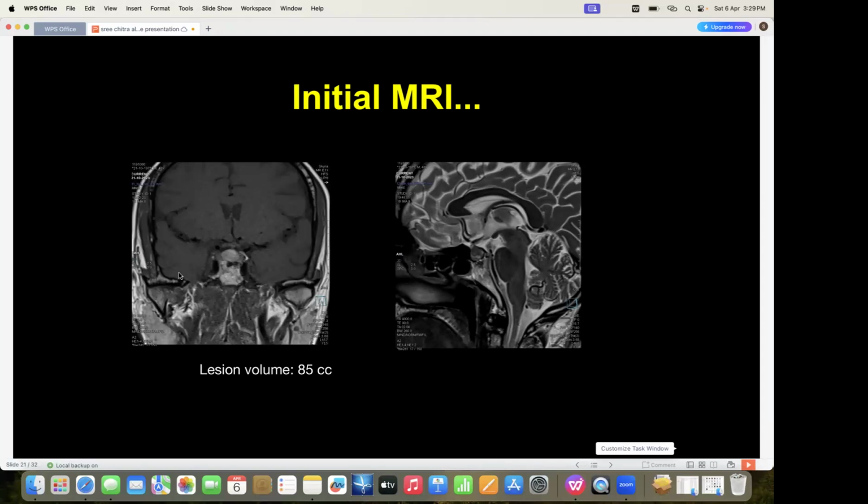The pituitary appears hyperintense on T1, and the craniocaudal length is probably increased. And how is it on T2? On T2, some central hyperintensities are there, with surrounding hypointensities. Predominantly the lesion is hypointense, and there is some cleft-like thing seen, but I'm definitely not able to see a normal pituitary gland. There is a hyperintense area inferiorly and some hypointensity.